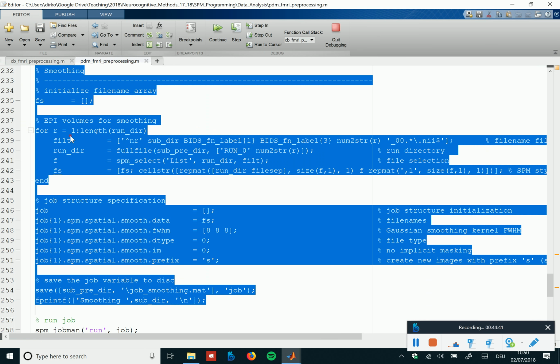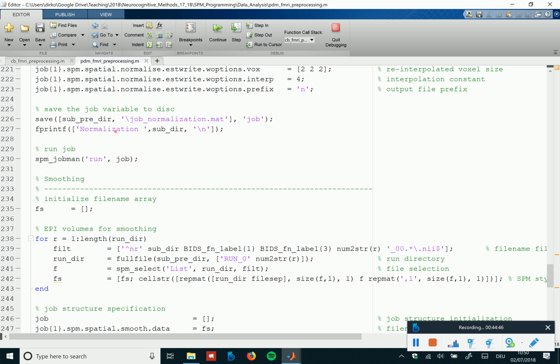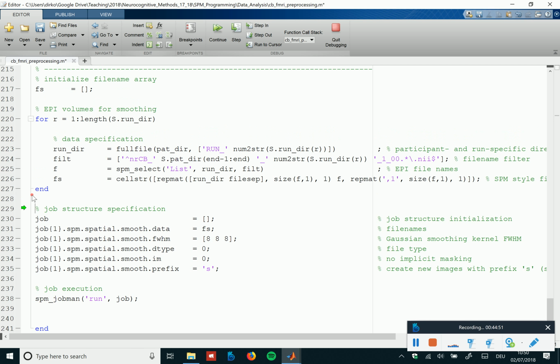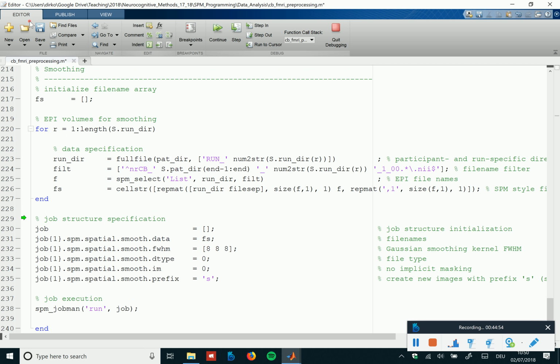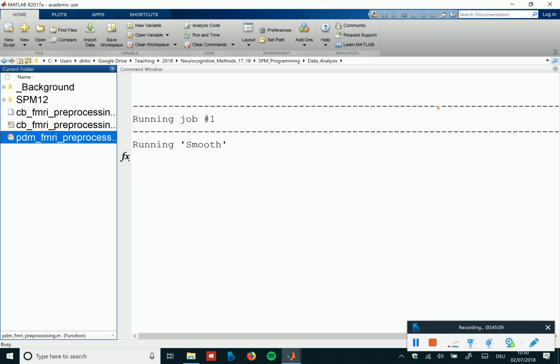And then we can just smooth the data to make it look more smooth. Oops, wrong script. Then we're done with the pre-processing. So maybe at the beginning of the next hour, you can decide, would you rather do a little bit of cleanup of this pre-processing and write a script that creates these images and maybe plots the motion parameters, or would you rather start with the GLM?